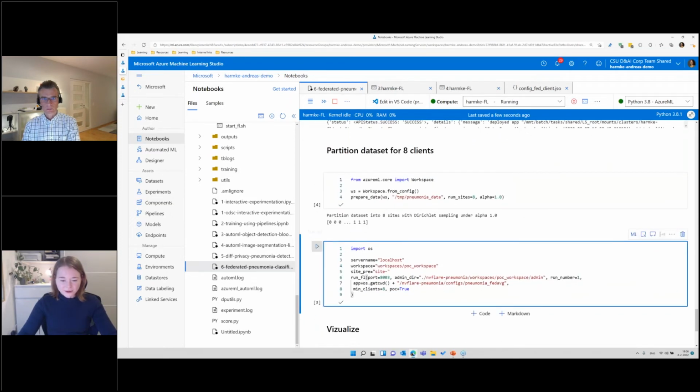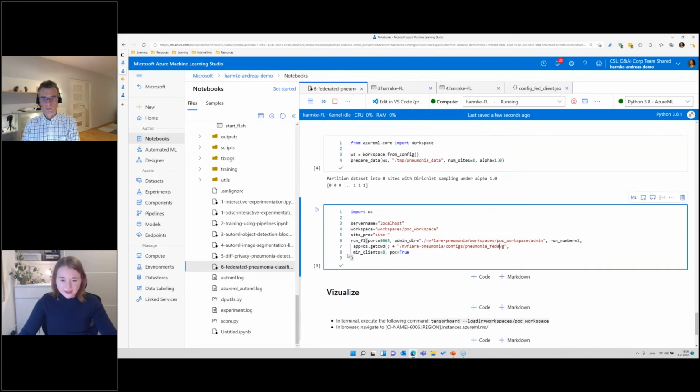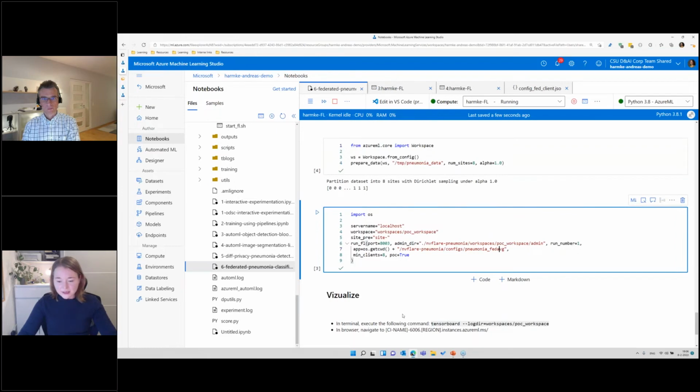So this is a lot of code, but after everything is executed from a code perspective, what we can do next is to actually visualize the data. And what is really nice about this library is that there's already a TensorBoard integration with it. So the logs that are being sent can be read directly from TensorBoard.